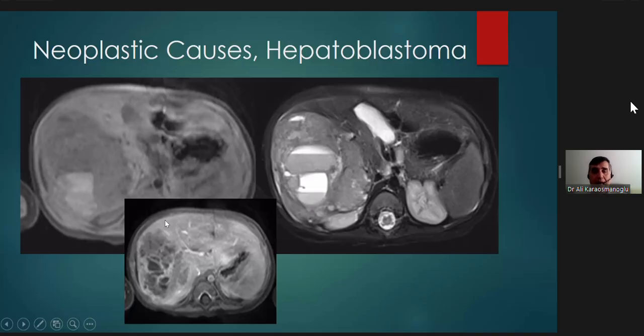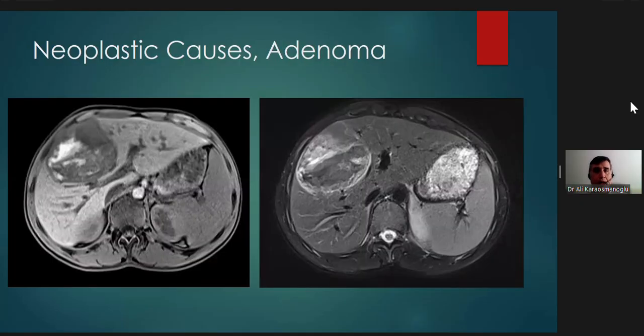Heterogeneous contrast enhancement. In a pediatric patient with no known history of malignancy, a large tumor in the liver is almost always conclusive for hepatoblastoma. So this patient later underwent biopsy after medical treatment, and hepatoblastoma was confirmed.